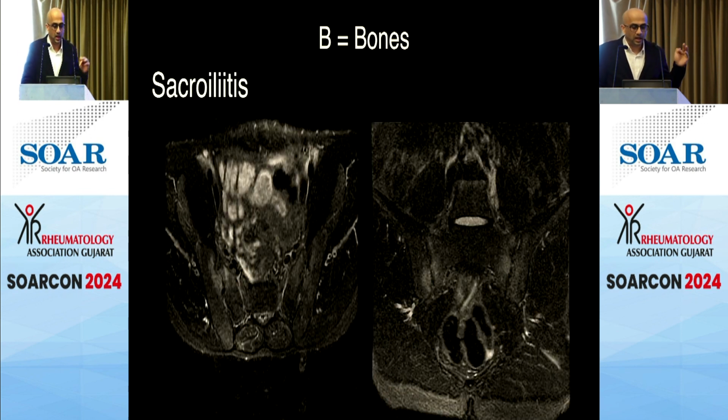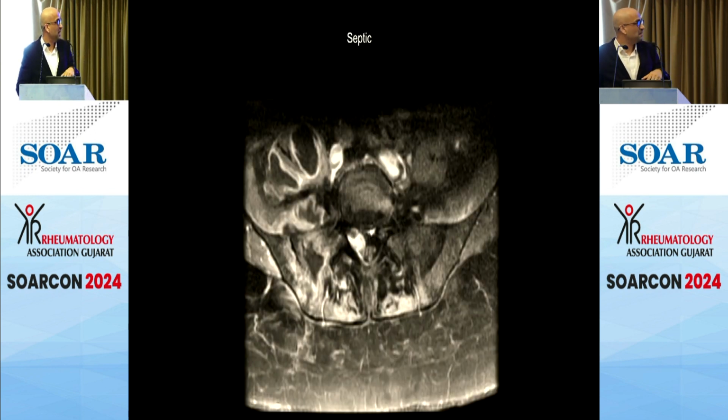disc space. Again, marrow changes in the sacroiliac region are sacroiliitis like this. You can see inflammatory changes. These are STIR sequences. You can see inflammation, bright signals here. Again, that's a differential diagnosis of back pain. So always get your MRIs, the axial sequences should go into the sacral region. So make sure that you tell your MRI radiologist that when you are assessing back pain, get axial images, because your sagittal images may not always give you that area in the imaging. Although they provide coronal STIR images where you can pick this up as well in the screening.